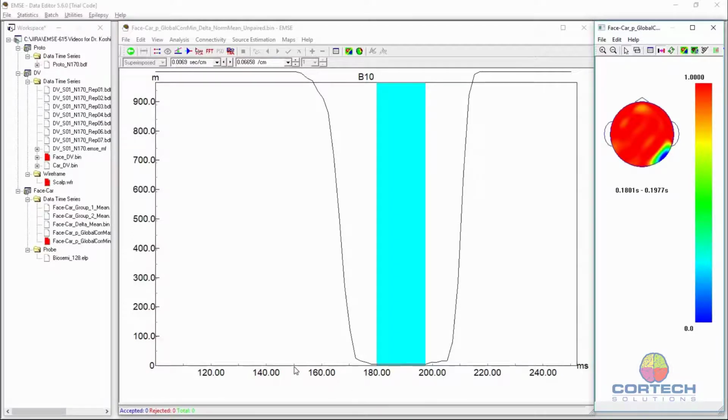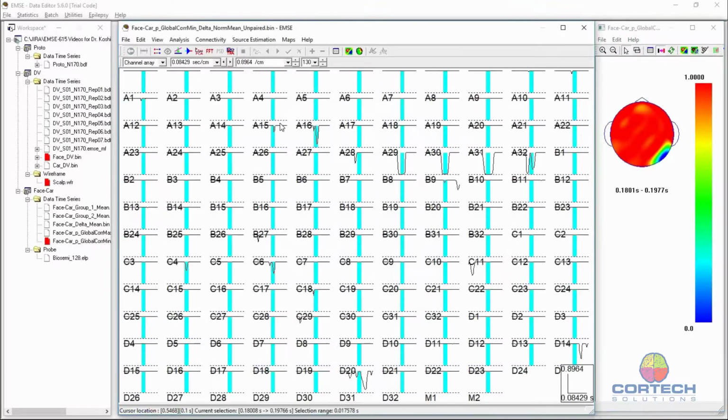The small values are as small as they can possibly be, given that we only did 200 permutations. But we can see from the map there are some others.